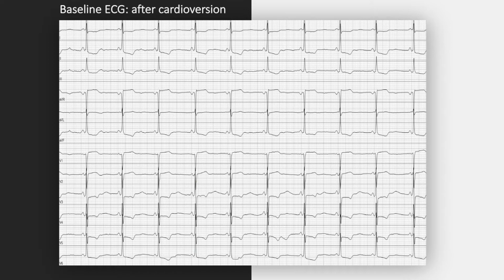The patient reported having recurrent tachycardia since childhood, which became less frequent over time until atrial fibrillation was diagnosed. Careful inspection of the ECG reveals a missing septal Q in left lateral leads, which represents the initial activation of the interventricular septum by the left bundle branch.